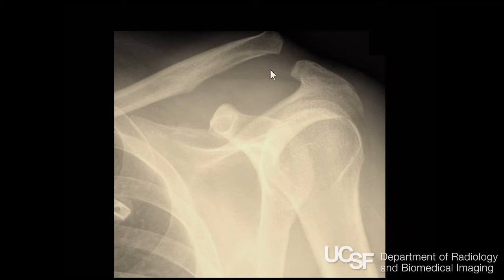You might have to do weight-bearing views with comparison to the contralateral side to sort out a second from a third degree separation, or in difficult cases where you're not sure if it is an AC separation at all. You do comparisons with the contralateral side and look for differences. The normal is about 3 to 5 millimeters between the acromion and the clavicle. And you want to look for a difference no more than 5 from the contralateral side with this.